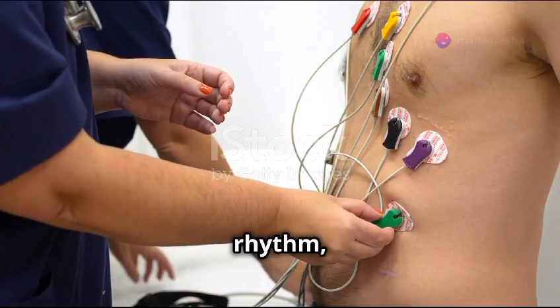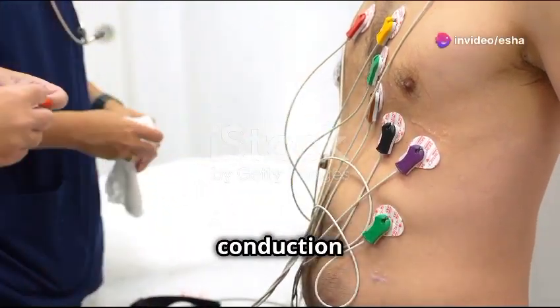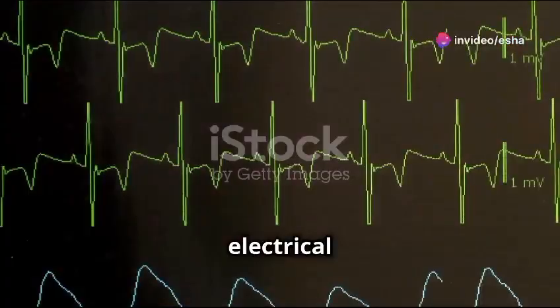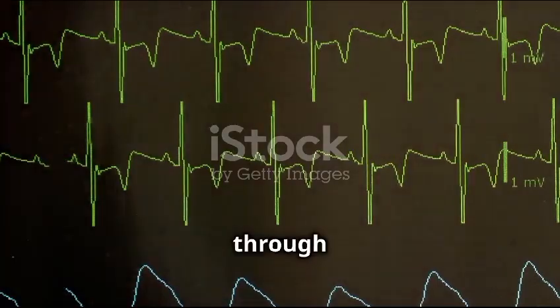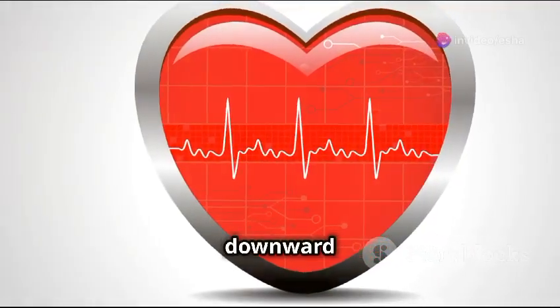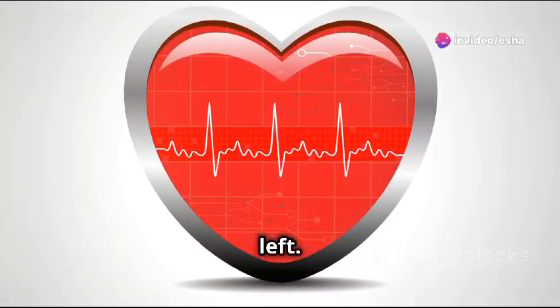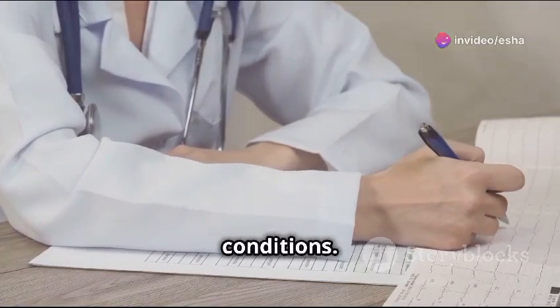Beyond heart rate and rhythm, the ECG provides insights into the heart's electrical conduction system. The electrical axis refers to the direction of the electrical current as it travels through the heart. The normal electrical axis is slightly downward and to the left. Deviations in the electrical axis can indicate underlying heart conditions.